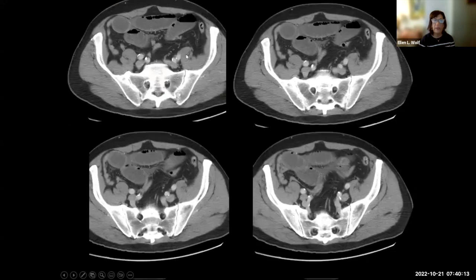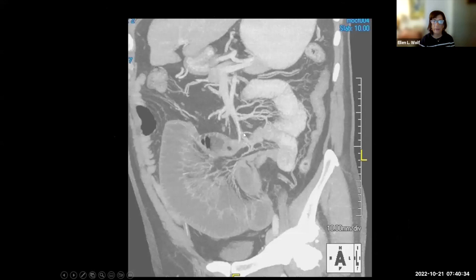So this is a patient that came in with small bowel obstruction. Again, we see the dilated fluid-filled loops, transition to decompressed loops. It wasn't anything really specific for closed loop, but it looked like sort of funny tethered loops, possibly in this location on the axial plane. It just looked a little strange. We did reformats in the coronal oblique position, and we can clearly see that this is closed loop obstruction.